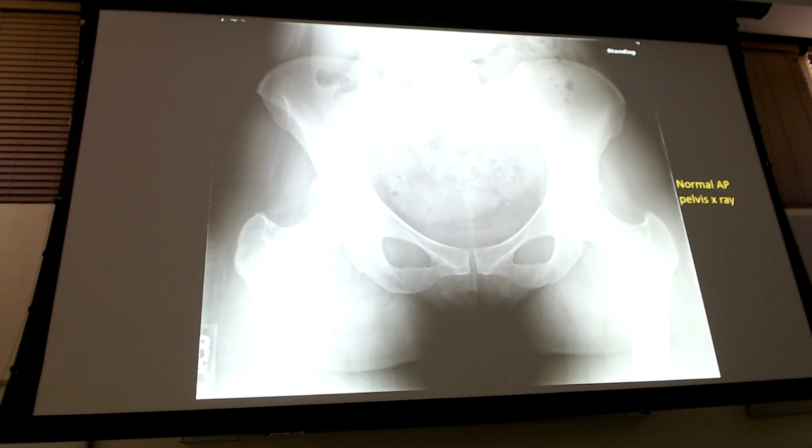So, but if you looked at this, and look at what we talked about, what we've seen picture-wise, would you pull out just that one thing and be like, oh, this is definitely it? I would want to know, let's say this was an older patient, and it's primary osteoarthritis, it should be bilateral, right? In order for me to buy this as an arthritis thing, maybe if she had a labral repair on her left hip 5 years ago, maybe a secondary if we were going to go there, but I would have to give you all that in a minute.